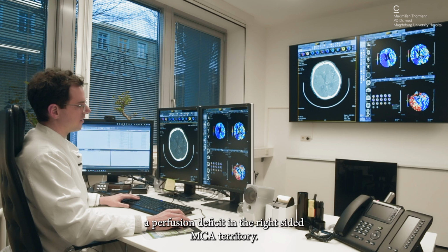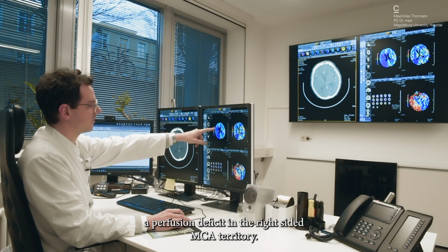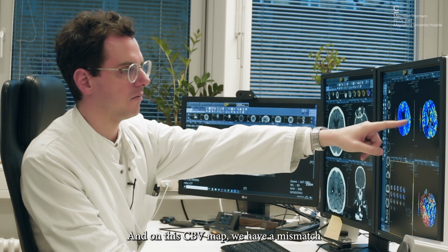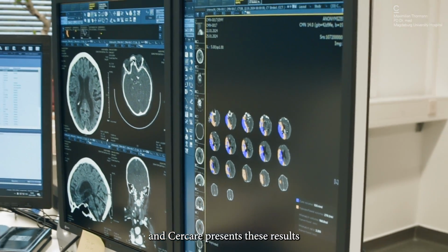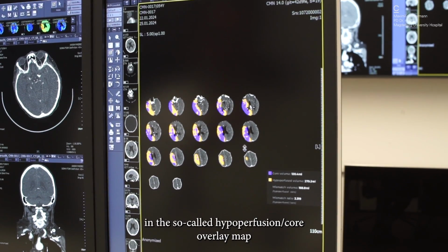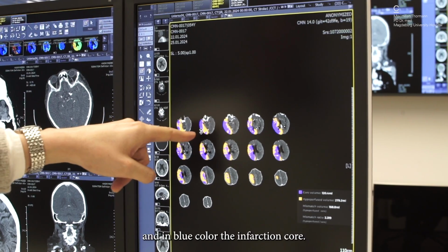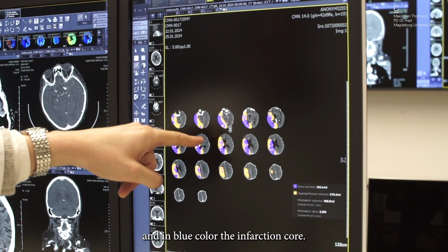If we look at the CT perfusion maps, we see here on the CBF a perfusion deficit in the right-sided MCA territory, and on the CBV map we have a mismatch. And Cercare presents to us these results in the so-called hypoperfusion core overlay map that shows us here in yellow color the hypoperfused area and in blue color the infarction core.